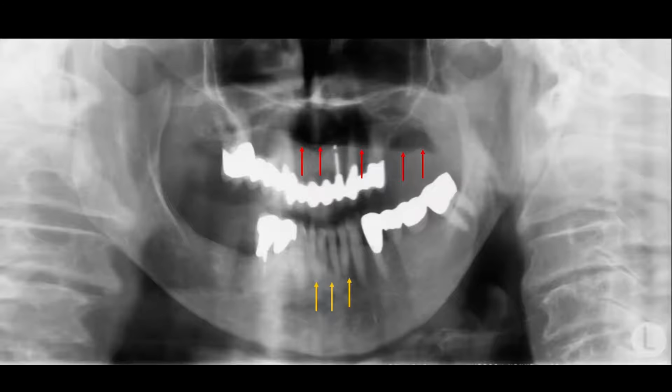Here is an actual patient. The patient is too far anterior in the machine, so the mandibular anterior teeth are very narrow. There are several other errors in this panoramic radiograph. We have already learned about tongue position error, and we can see the dark area over the maxillary teeth. This patient was slouching in the machine, so we have vertebrae on both sides superimposed over the ramus, mostly on the right side. There are other errors on this radiograph, such as the chin is too far down. Let's review the chin down position in a few minutes.